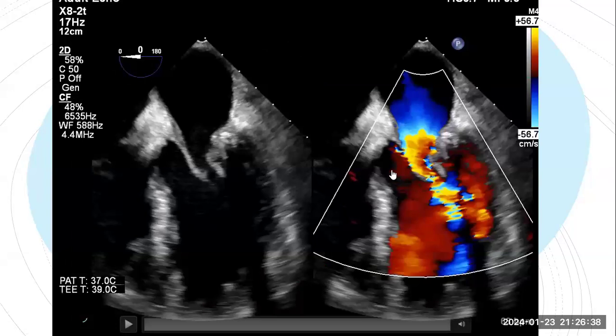Any VSD, Dr. Yasser? No, there is no VSD. This is just because of the view itself. But there is no VSD at all.